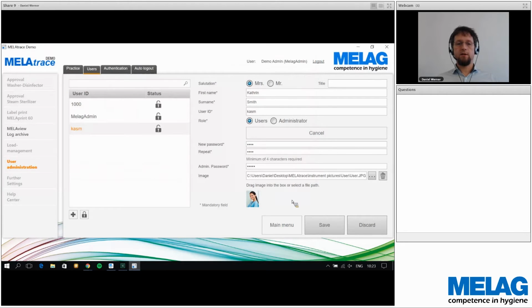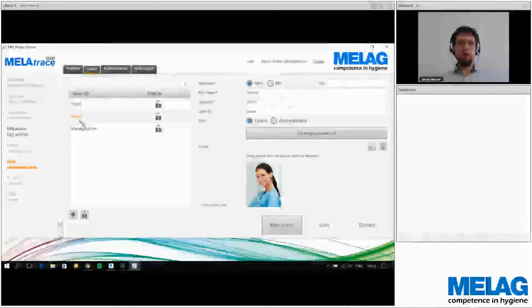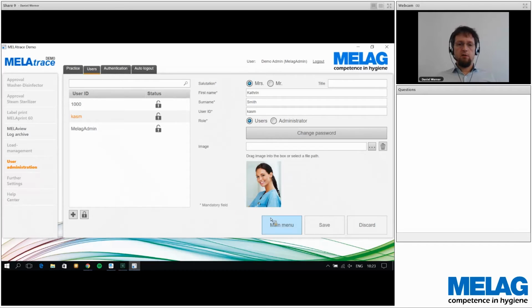That's it. Now we have here Catherine Smith in the list. I have some more points here, authentication and auto logout, so I can really customize that software according to the practice.